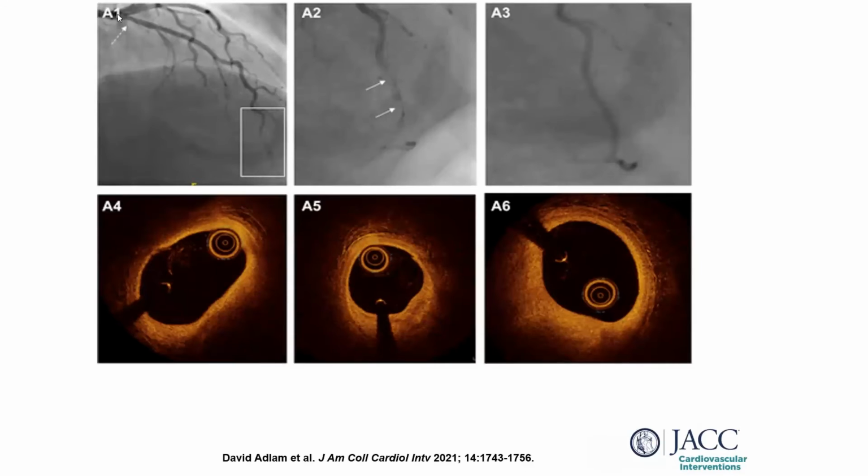This is another case in a young woman where a distal type 1 SCAD was suggested. Young woman, no calcium, that double lumen appearance and long lesion, they thought it's type 1 SCAD possibly. And eventually it resolved with Integrilin. Now they did an OCT, and the OCT actually suggests heavy atheroma. So this was not actually a SCAD case. This was atheroma. So keep in mind, atheroma with thrombus can look like SCAD. And that's the dilemma we will have going forward.